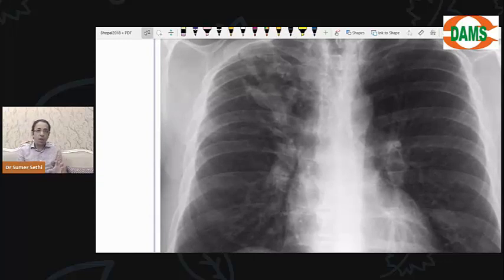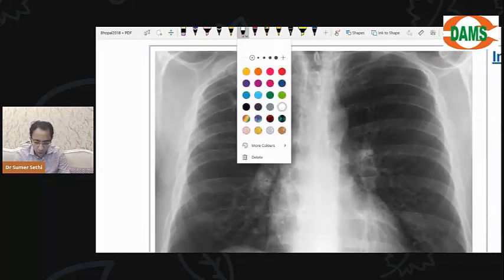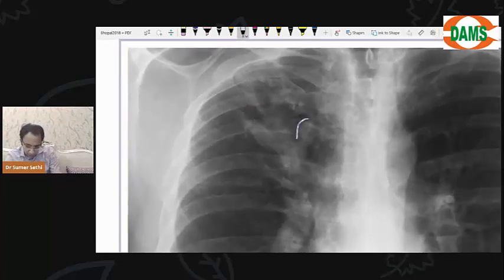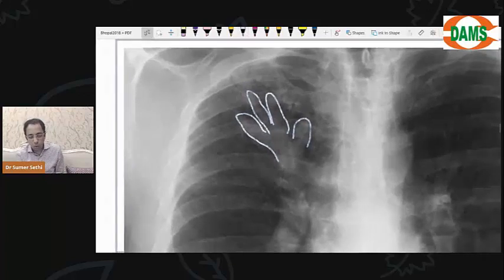Now these bronchi which are filled up with mucus, when you look at them on X-ray, they will appear opaque. They will appear white. Let me show you how they look. Please see, I am trying to zoom the image to the maximum. Can you see these mucus-filled bronchi which are appearing white? This white thing that you see here, the opaque thing, these are all mucus-filled bronchi that you see in ABPA. Now, can you look at them with me and tell me what the appearance is?